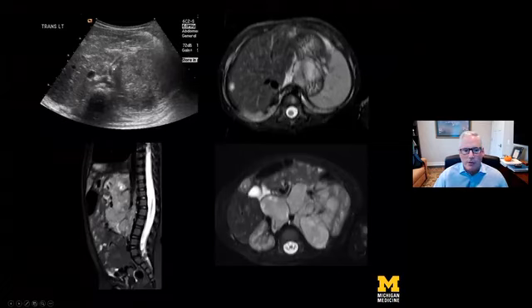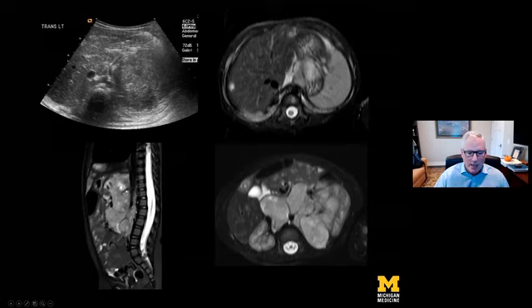Another patient who has a large suprarenal mass on the left already has metastatic disease based on the T2 weighted MRI, and we can see the encasement of the celiac trunk. We see encasement of the descending thoracic aorta, abdominal aorta, and again, this large abdominal mass. Again, encasement of the aorta, not as elevated, but encasement of some of the branch vessels such as the SMA.